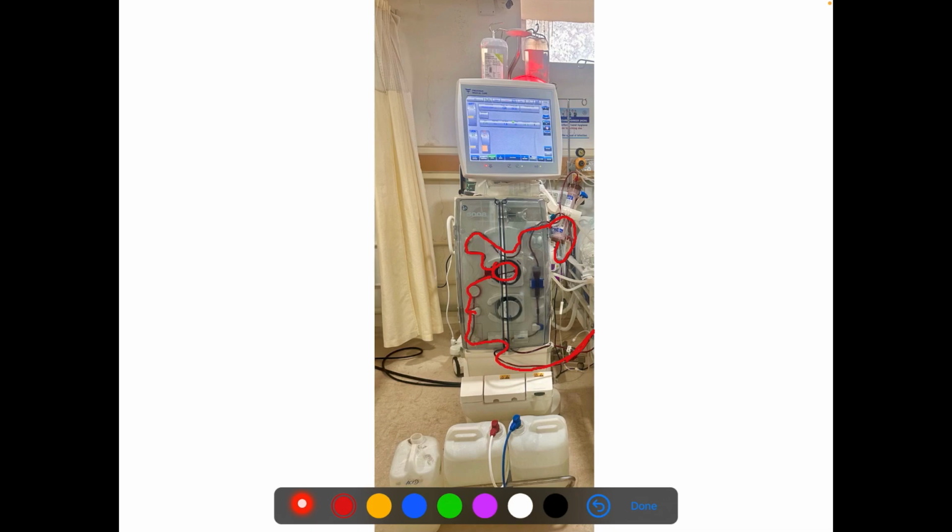This machine particularly does not have it, but generally a machine has some parts in the pre-pump part, that is a pressure gauge. Maybe somewhere here we have a pressure gauge. The pressure gauge is needed to measure the pressure of the circuit. It is useful when there is a circuit leak or break, so there is a loss of pressure. This can be detected here and we can get an alarm on the screen. So that is why we generally have a pressure monitor over here.